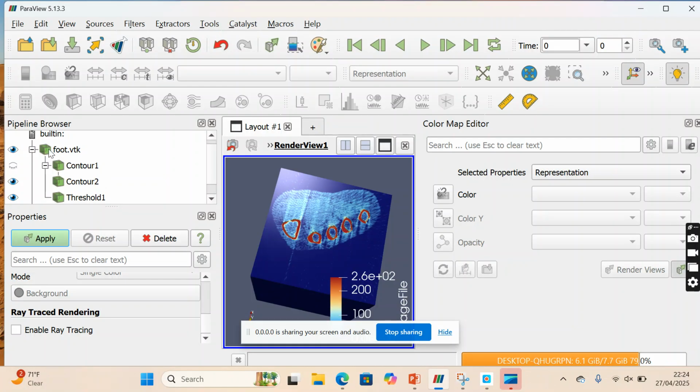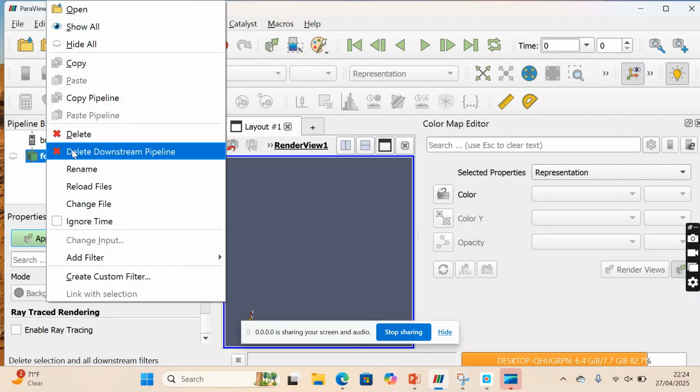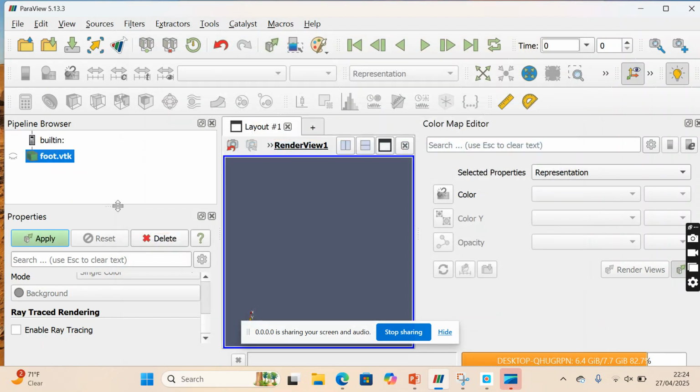Oh, let me first delete this. So apply it.